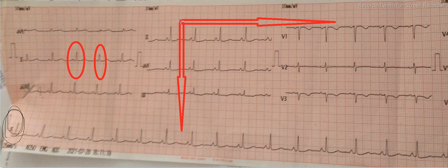In lead 1 the vector is positive, so what will be the direction? It will go like this, in the positive direction. Since the arrowhead is the positive direction, it will go here towards the left, isn't it? Looking at the magnitude, we draw up to here.